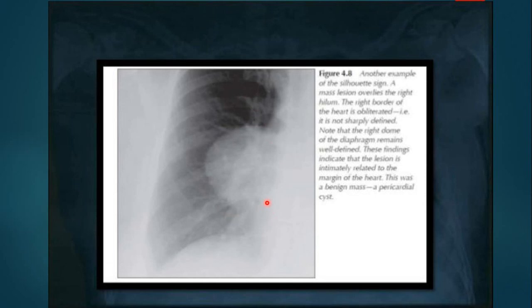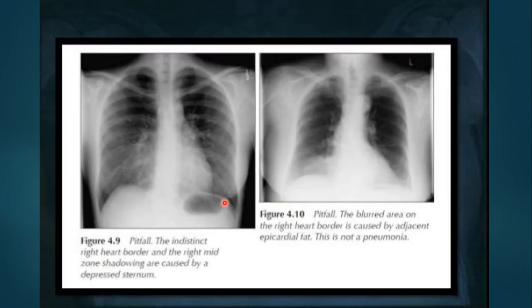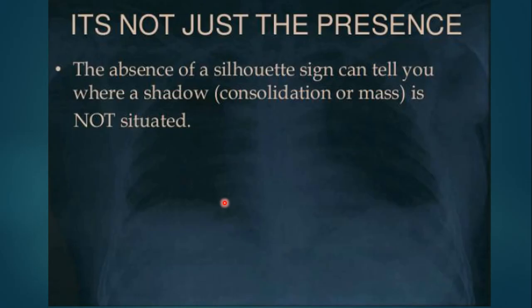If this lesion is in the lung, the angle will be acute. While if the angle is wide, it's obtuse, the lesion is outside the lung. Good. I'm sorry, some disorientation. No problem. So let's continue.